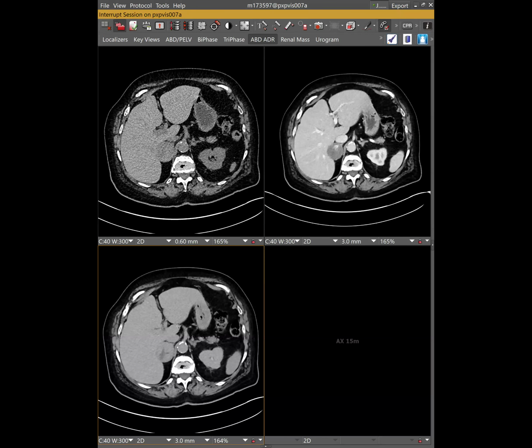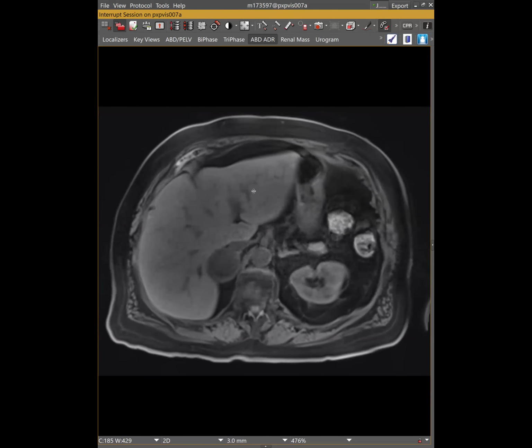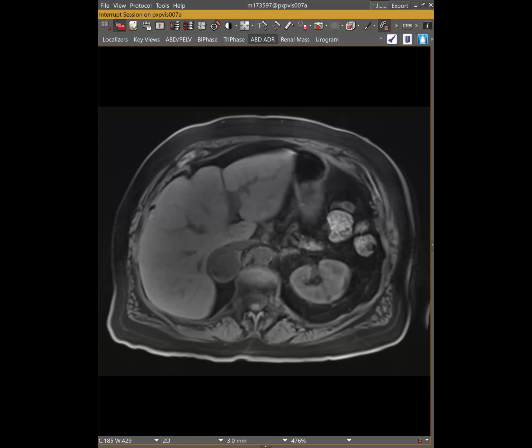Do you have the T1? Yeah, let's see. The pre-T1 right here. So I don't know. No, we can't kind of see it. We can't see the pre-T1. Oh, hold on. Let me see. I put it on the wrong screen. It is right here. Oh, wow. Yeah. Amazing.